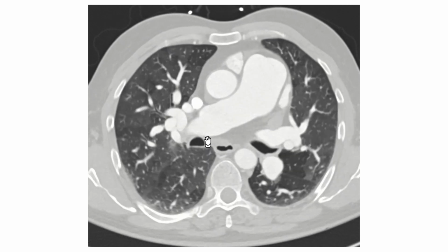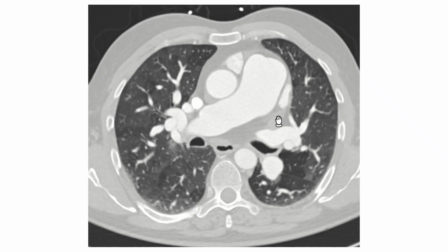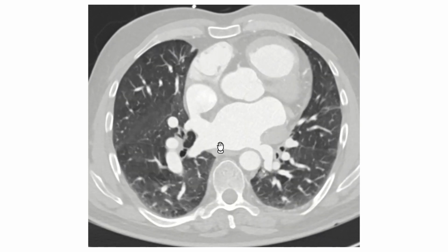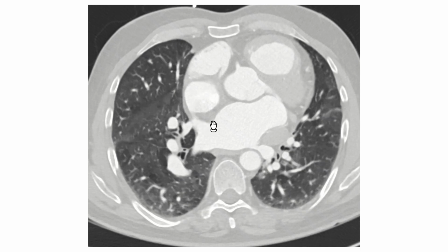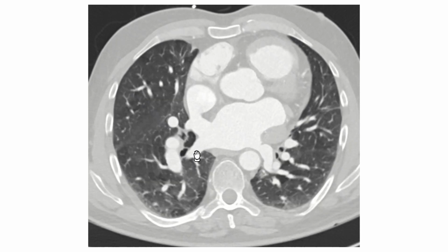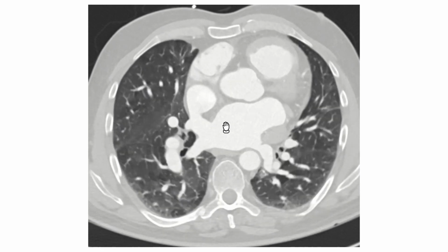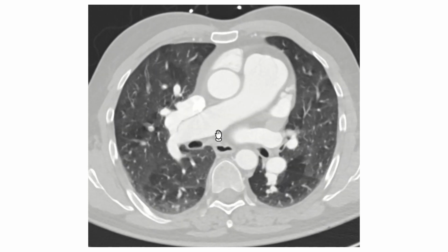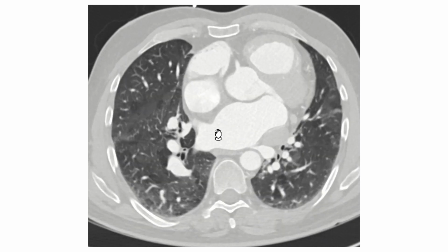So CT could give the diagnosis, and also could detect complications, for example pulmonary hypertension and changes in the lungs. However, a step further, CT could also provide measurements on whether it would be suitable for a percutaneous solution or only for surgical assessment. By providing certain measurements, we could give insight to the interventionists and the surgeon on whether they would be able to close it surgically or percutaneously.